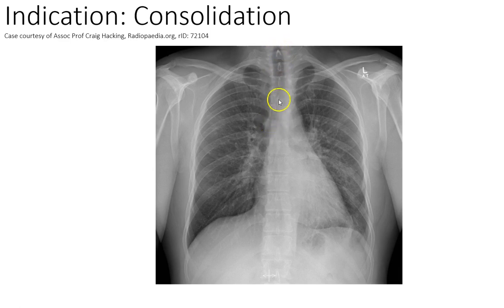I'm looking at the trachea. It's nice and straight and central. I can see it down to the bifurcation to the two main bronchi. I can't really follow it further on this side, but on this side I am following it further, and I'm checking the lung markings, and I can see them all the way to the edge.